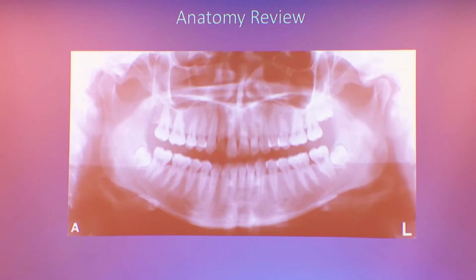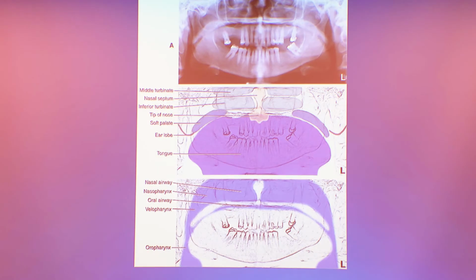Again, you can use this for your reference. Let me point out again, the nasal cavity floor is here, this opaque line. It's the flip side of the top of the hard palate, which is imaging all the way up to here. The ghost and the primary images of hard palate, all of these opaque, horizontally oriented parallel lines, if you will, are all part of the hard palate. Again, for your reference.